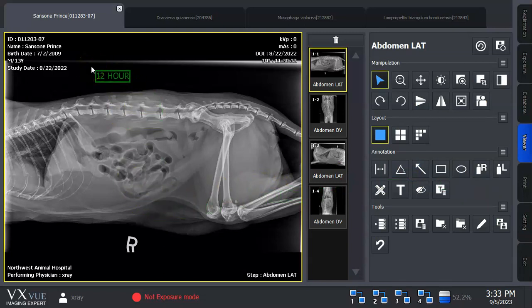When an annotation is selected, you can drag, using no mouse button other than moving the mouse into the image where I want the image annotation placed and clicking the left mouse button. After the annotation is placed, you can always manipulate to make larger, smaller, or move into a different area later on.